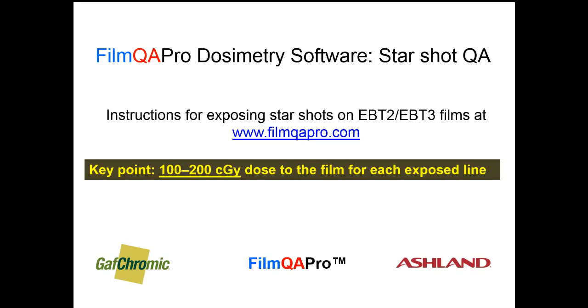That should be sufficient to make a high contrast mark. For a gantry starshot using build-up blocks, tailor the monitor units delivered to achieve that aim. Collimator and couch starshots are typically made without a build-up layer on top of the film, so the monitor units will need to be increased to compensate for the lack of electron equilibrium.